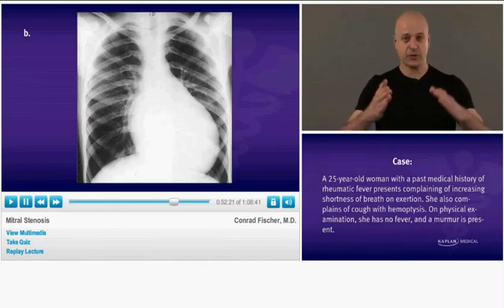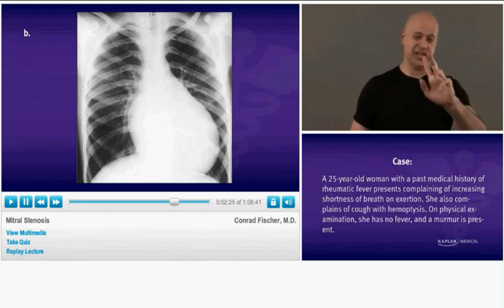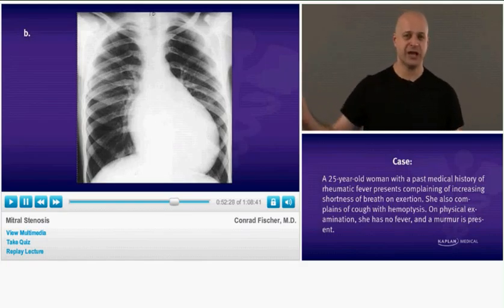This one is big, but it's going out big to both sides. This is like a dilated cardiomyopathy. This is alcohol effect on the heart. This might be a dilated post-myocarditis person.